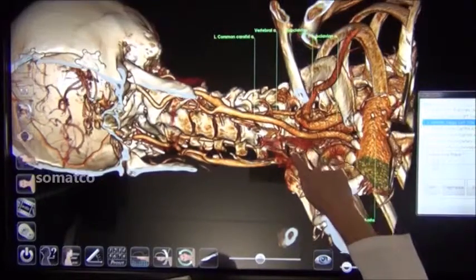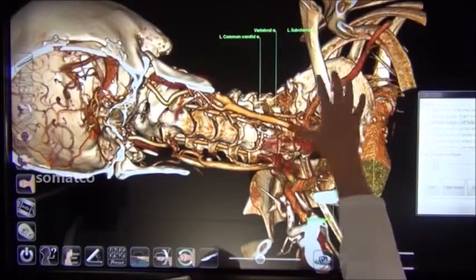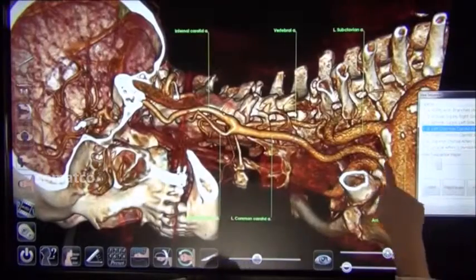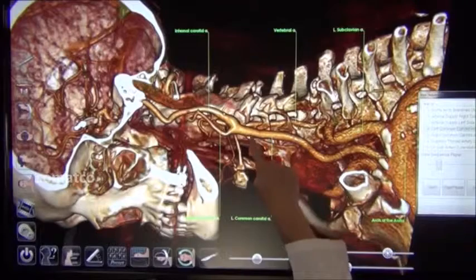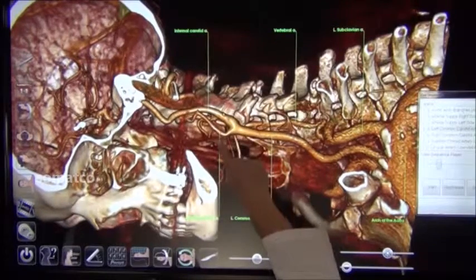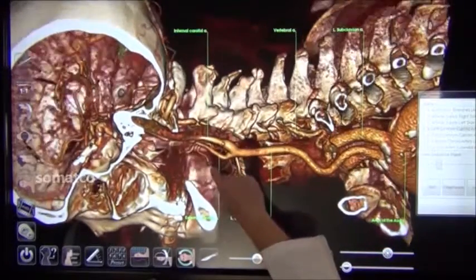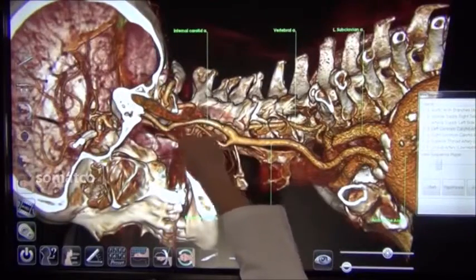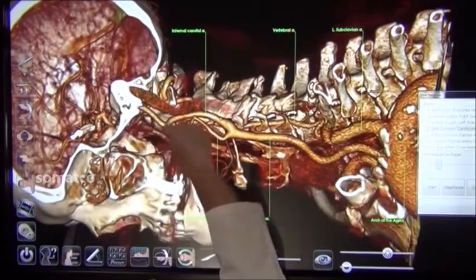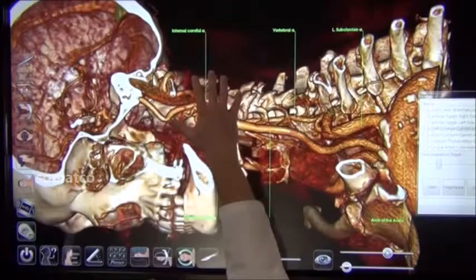As on the right-hand side, we can see the vertebral artery originating off of the subclavian artery on the left. As we continue moving superiorly, we will follow the left common carotid artery and see its bifurcation near the carotid sinus to the internal and external carotid arteries. The internal carotid artery is located more posteriorly and will ascend to give blood supply to the brain. As we can see, no branches are external to the skull off the internal carotid artery.